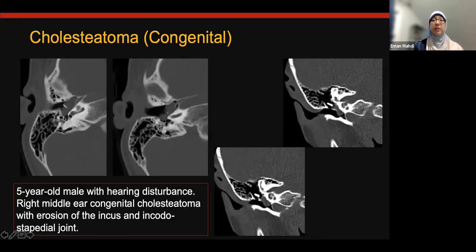So that's the case, a congenital cholesteatoma. It's adjacent to the ossicle. We see it on the axial cuts, but on the coronal cut, that's where the scutum is. The scutum is basically where the tympanic membrane attaches, the separation between the external and middle ear cavity. When we see the scutum, the space is the Prussak space, because this is the malleus, that's the Prussak space, and that's the scutum. However, this one is situated more medial to the ossicles, so it's more typical of congenital cholesteatoma.